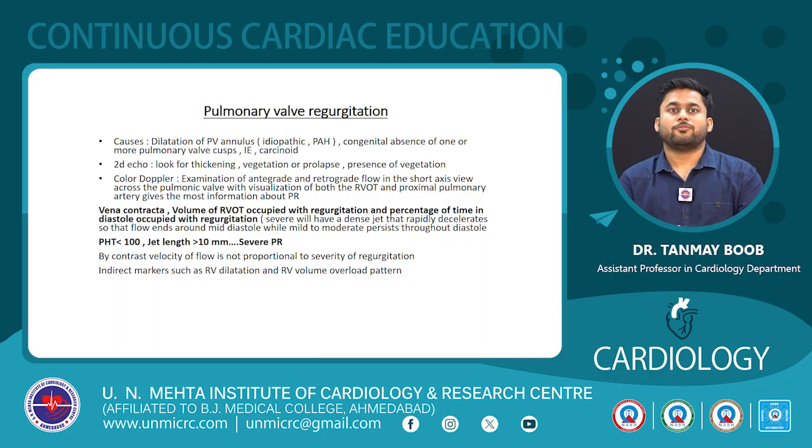On 2D echo, you look for thickening, presence of infective endocarditis vegetation or other vegetation, prolapse. Color Doppler examination of antegrade and retrograde flow in short axis view across the pulmonary valve, with visualization of both RVOT and proximal pulmonary artery, gives the most information about PR. We calculate vena contracta, volume of RVOT occupied with the regurgitation jet and percentage of time in diastole occupied with the regurgitation. Severe will have a dense jet with rapid deceleration so that the flow ends in mid diastole, while mild to moderate will persist throughout the diastole.